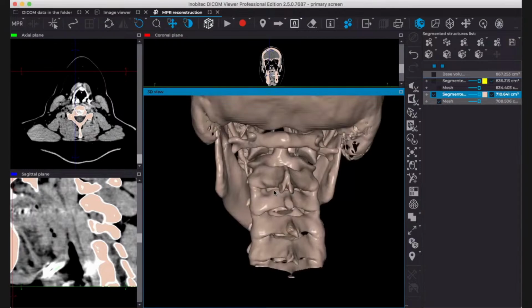So how do we separate the vertebra now? We are going to use two things from our panel. First, this little icon here, which is a marker. And then this other tool, which is Watershed segmentation. So now what we need to do is to create different masks for the different objects that we want to create. And this is very easy. I just want to duplicate whatever I have here. So you go to copy the segmented structure.